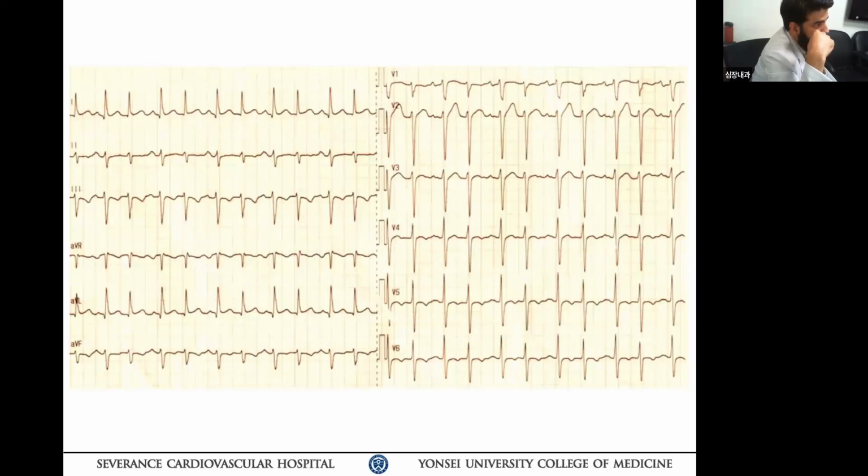The other is that possibly this patient has dual AV node physiology, so the same sinus beat is going down, the first QRS probably down the fast pathway, and the second one down the slow pathway. So one P wave conducting down both. You mean the 1 to 2 conduction. Yes, a single P wave conducts to the first through the fast and the second through the slow.